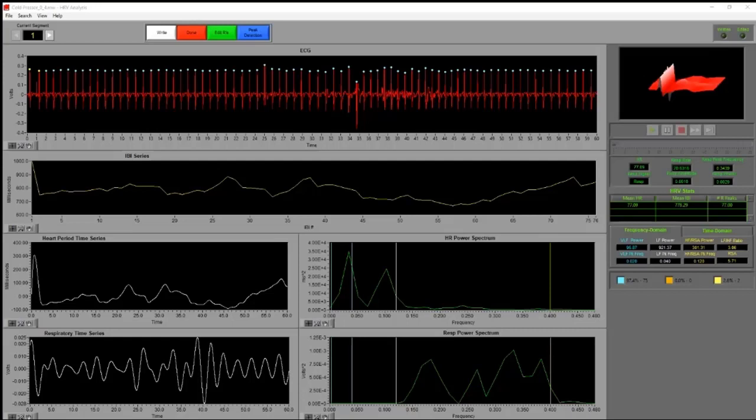So next question: is the midbeat placement calculated from the overall IBI of the segment file, or is it looking at the section in between the cursors? What's really happening here is the location uses the beats between the cursors specifically. So the number of beats to be inserted is calculated from the overall segment. It's not just looking at the surrounding, it's looking at every single interval, and what is that average?